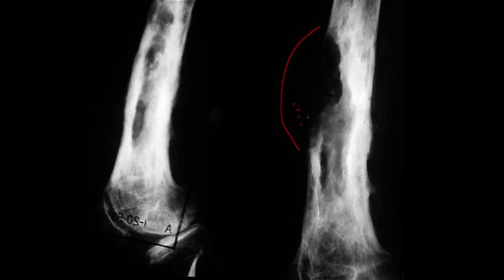Well, this is likely some amount of squamous cell carcinoma of a sinus tract or area in between. So this would be a Marjolin's ulcer. So thickened cortex, sclerosis, superimposed osteolytic change. So chronic, maybe some active areas of osteomyelitis, as well as a Marjolin's ulcer or squamous cell carcinoma.